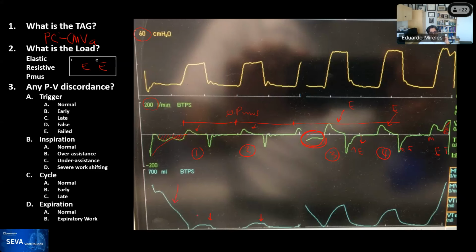Actually, look at the volume getting out of this patient. Actually, this is a good example. This was the breath. It ended right here. So this breath over here is the continuation of this breath. I just realized that. So the patient had the early trigger and then exhaled forcefully during this period over here. Does that make sense, Rob? Yep. It's refreshing the screen, so I cut it in the middle. So there's one early trigger, but the rest are just mechanical.